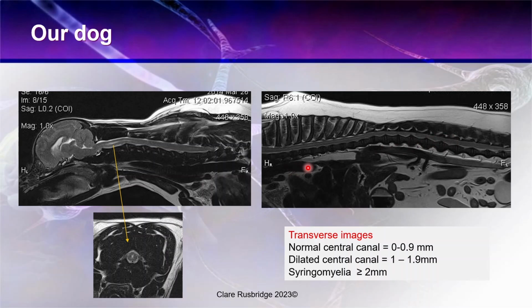In some other breeds, such as the French Bulldog, you may have a much bigger syrinx here in those very brachycephalic dogs. So we can see in this dog there's a very small syrinx here and not much to see everywhere else. There is, however, some bumpy bits here, and we will want to further check those out with transverse images to see if there is a significant disc herniation at that point, and another explanation for that spinal pain.